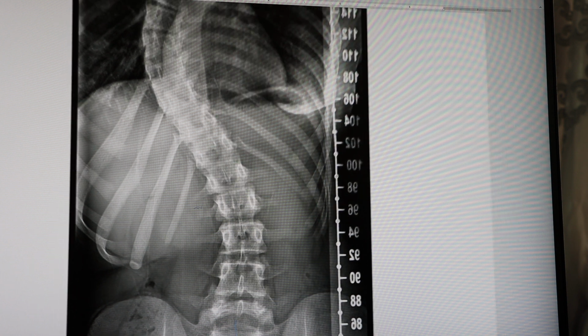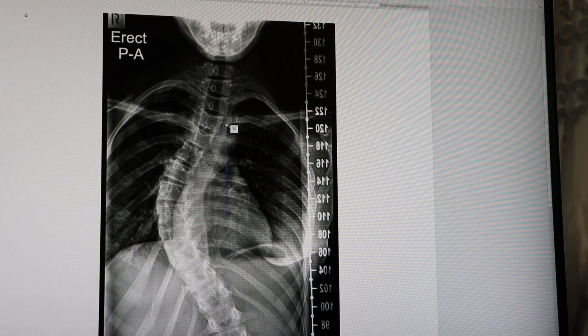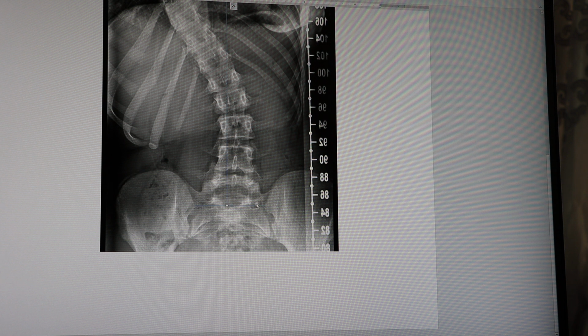Now let's zoom it out, and now let's draw our line. Again, make sure it's 90 degrees, depending on the parameters here. For a vertical line, the width has to be 0 to identify it as perpendicular to the horizontal. For a horizontal line, the height has to be 0 to identify it as an actual horizontal line. So now this is our central sacral vertical line.